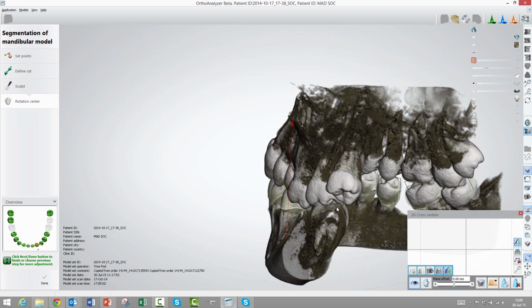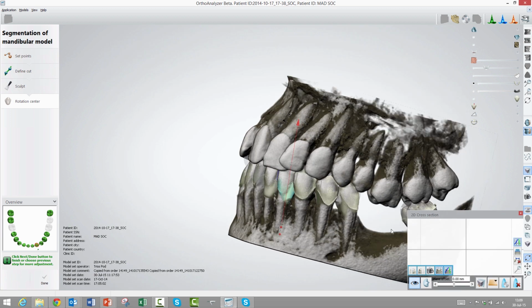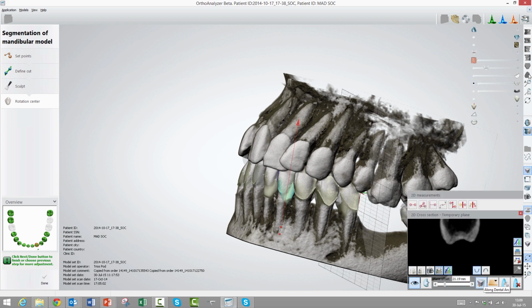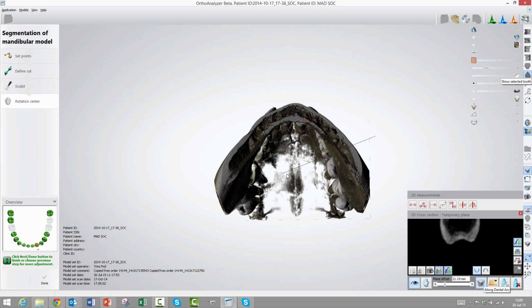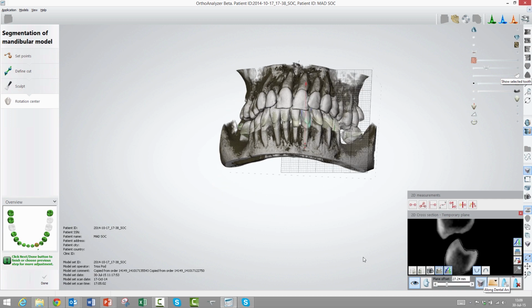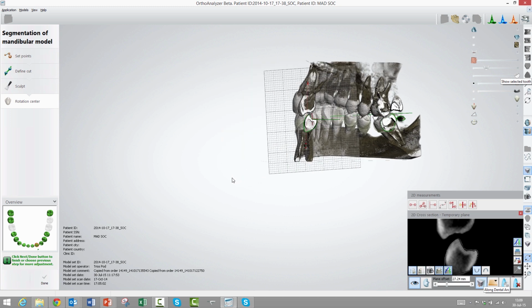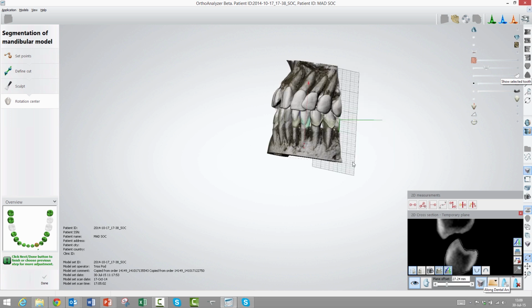I'm not going to save it. And we also have another possibility. Down here we have along the dental arc. And if we activate it, I will just show you from a short view. This arc here will just go around the dental arc instead. So we have a different view. And exactly as before, you can go in and clip it and take a side view of the teeth in that direction.